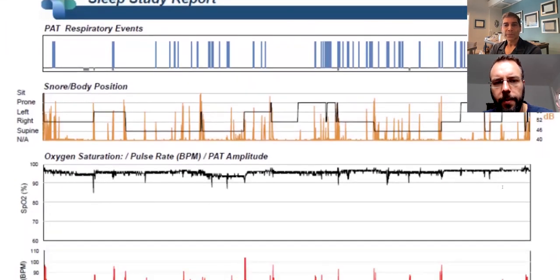And then, if I look at the various charts, very kinetic sleep. I don't really have a flavor for when to call it kinetic or not. I just kind of look at it, but it looks like they move a lot. They're not just still, right? They're shifting a lot.